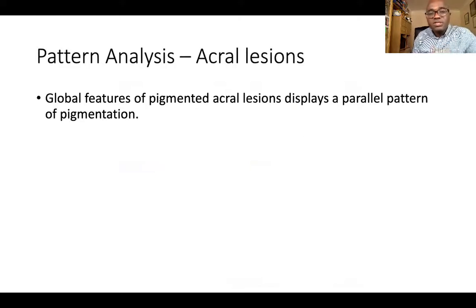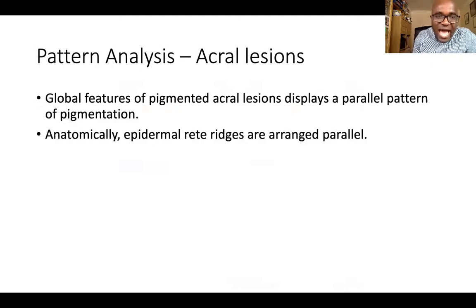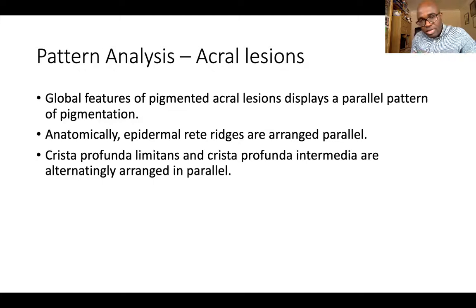So the global features of pigmented acral lesions display what we call a parallel pattern of pigmentation. Anatomically, epidermal rete ridges are arranged parallel. The crista profunda limitans or crista profunda intermedia are the surfaces. I'll show you the image of the cross-sectional surfaces of the palmar and the plantar surfaces, which are alternate parallel in the way they look.